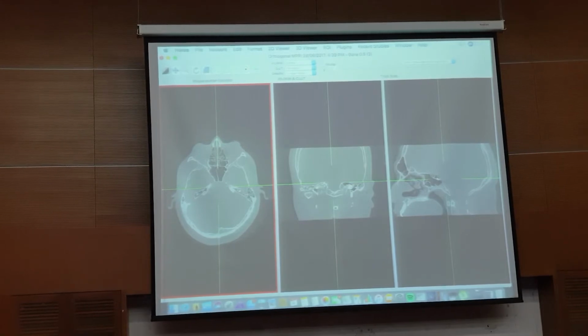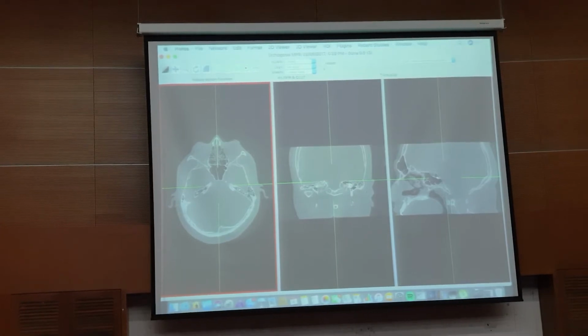Because in a sense I understand why, because you're trying to imagine that you are an endoscopist going through the nose. So that's why coronal views make sense to you guys. And I do agree, it actually shows a lot more information than axial view. Having said that, because we are radiologists, the MPR does show us sometimes other things a little bit clearer. But if I were to be asked which is the one plane I will keep, it's obviously the coronal view.